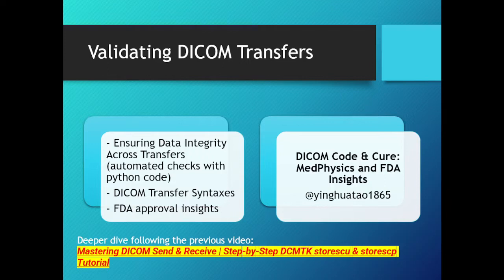In today's video, I want to show you how to validate DICOM transfers to ensure data integrity after DICOM transfer. This is a deeper dive following my previous video, Mastering DICOM Send and Receive: Step-by-Step DCMTK Toolkit for storescu and storescp. In today's video, I will also talk a little bit about the DICOM transfer syntaxes as well as FDA approval insights if you want to develop a medical device using these DICOM tools.